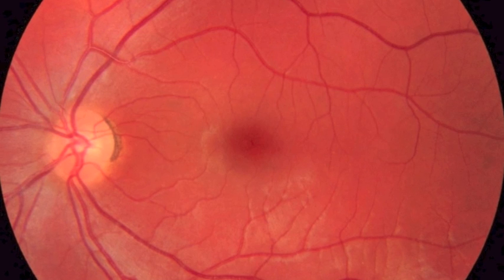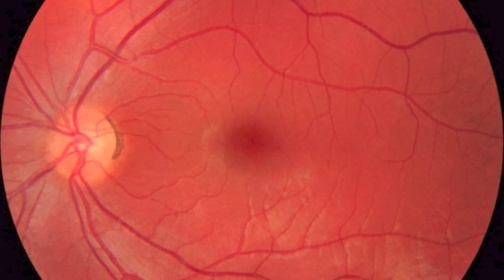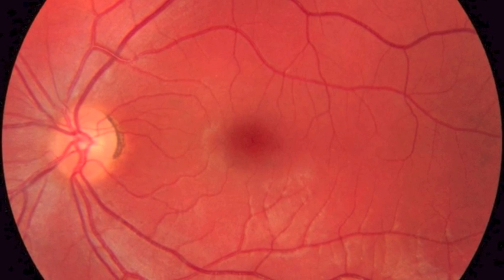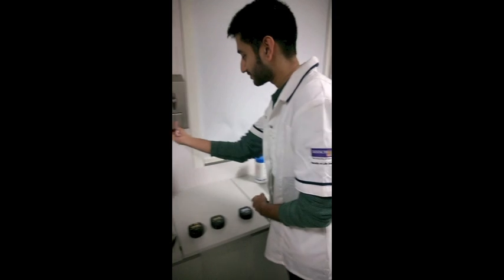Indirect ophthalmoscopy is indicated when you need to see into the periphery, get a better idea of depth, or for some co-management schemes. Specific indications include flashes and floaters, diabetic retinopathy, ocular tumours, swelling and cupping of the optic nerve head, high myopia, glaucoma, and age-related macular degeneration.